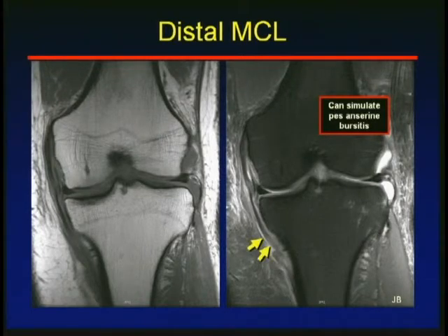The tendons of the pes anserine ride just superficial to the distal medial collateral ligament. So if there is pes anserine bursitis and a lot of inflammation there, you'll see fluid. You may see some reactive changes in the ligament below it. So the findings that are going to help you obviously are going to be the presence of history or valgus contusion in the bone, letting you know that there has been some sort of a traumatic event that has taken place.